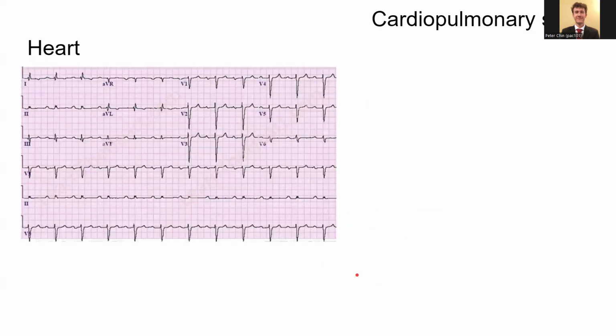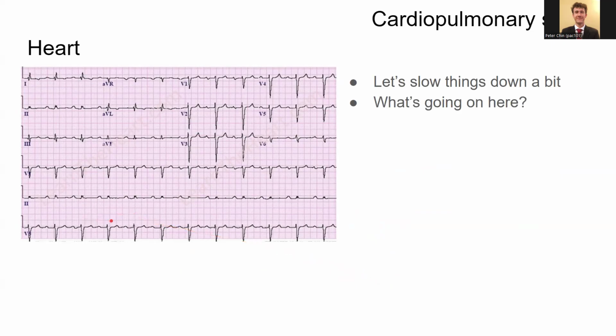Okay, so we're going to slow things down a bit, quite literally, because we're going to talk about bradyarrhythmias. So in this EKG, again, we'll look at each EKG because these are a little bit easier to compare to normal and determine what's going on.